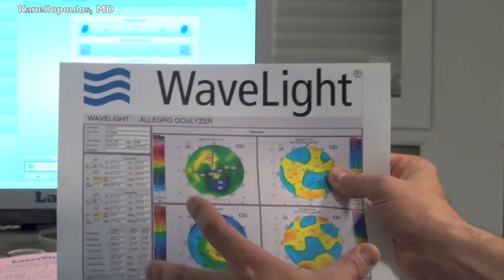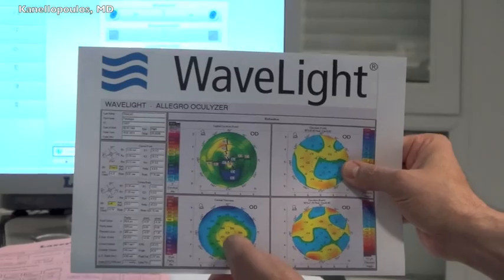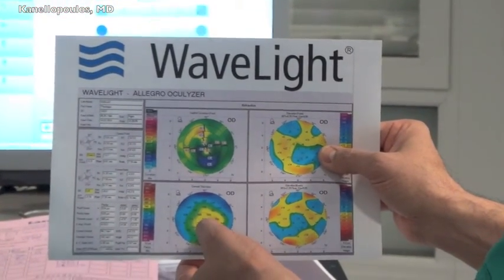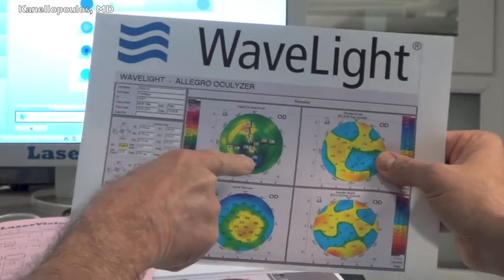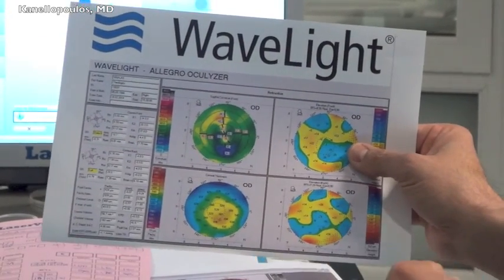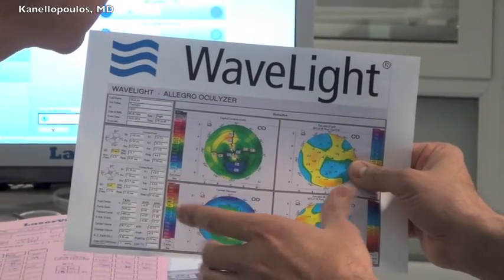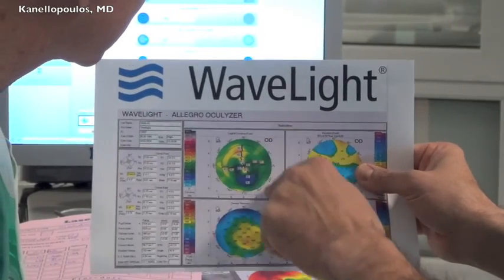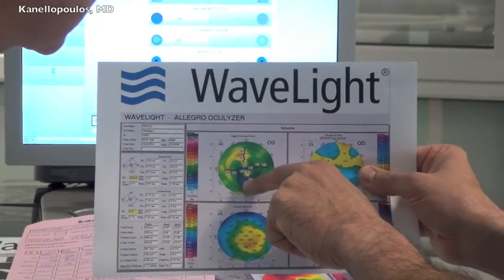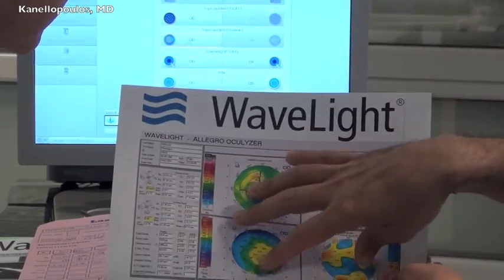Okay, so this is another case. This is not keratoconus, although as you can see here, the cornea is thinner at this area, which is inferior. This is actually a cornea scar. It's also flattened. Exactly, and it's also flattened. So this is a cornea scar from a contact lens infection on this patient that has created a significant step in the center of the cornea, very flat, inferiorly very steep, superiorly, and we have imaged this by pentacam.